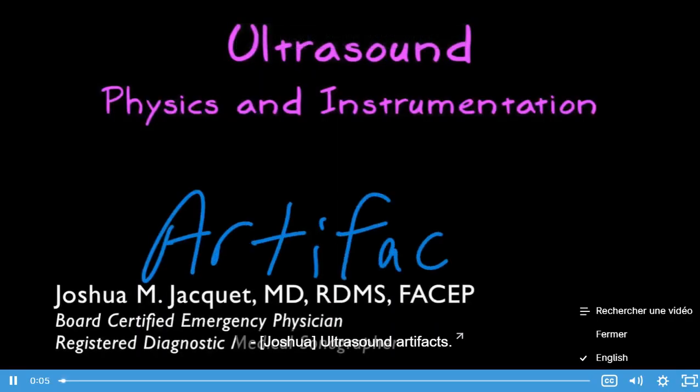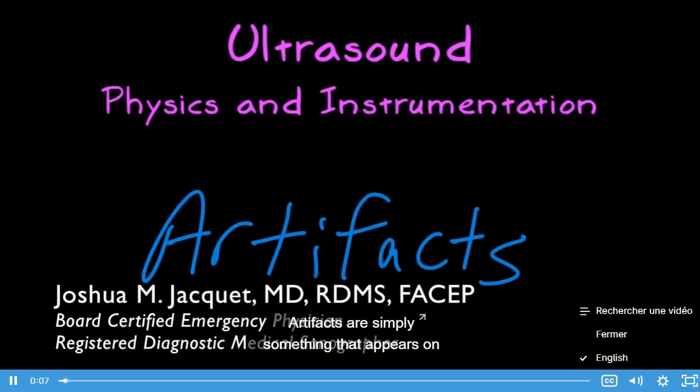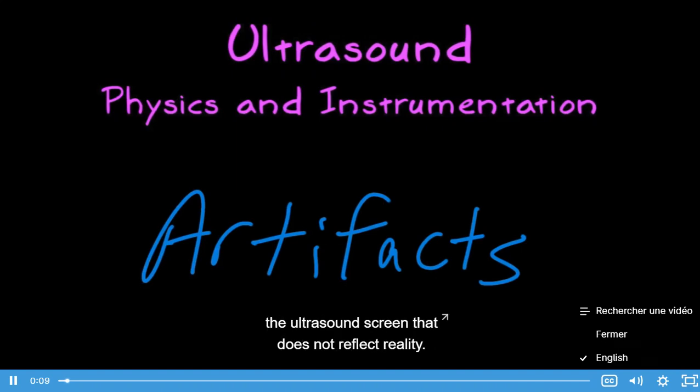Ultrasound artifacts? Artifacts are simply something that appears on the ultrasound screen that does not reflect reality. It's artifactual. See, ultrasound technology makes certain assumptions about the speed and the direction of sound in tissue. If these assumptions are violated in any way, it results in artifacts.